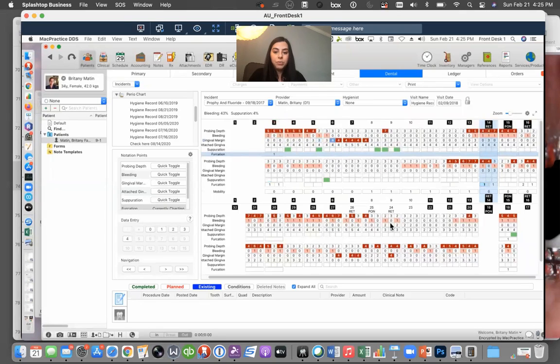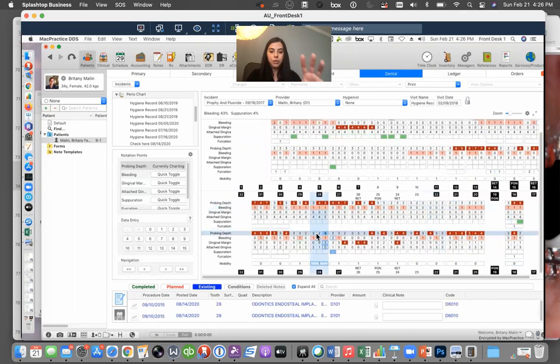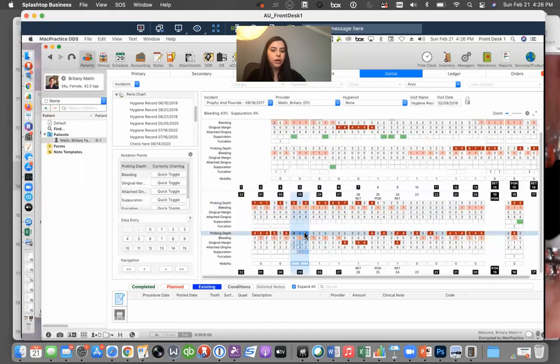Another couple of tips and tricks, and you probably already saw me struggle a little bit. If you jump around on the periodontal charting by clicking in different boxes, Macpractice has a mind of its own. It doesn't always go in this nice, sweet order that you're seeing it do right now. It will jump around. So if you skip from one area to another, make sure for the first 3 probing depths, like 3, I'm going to hit 3, I'm going to click this 2 button over here. You see how it jumped back to that first box? You've got to click on the second box, click on the third box, put that third periodontal probing depth, click on the 4th box. And once you've clicked on the 4th one, you are good to go. It is just the first 3 boxes that give you the problem when you're charting.